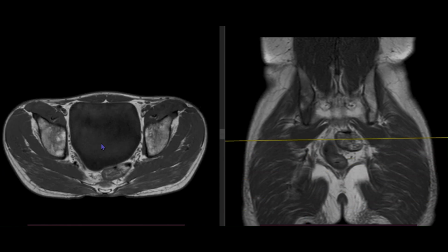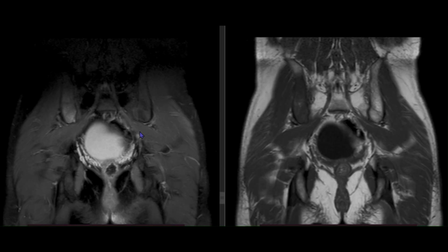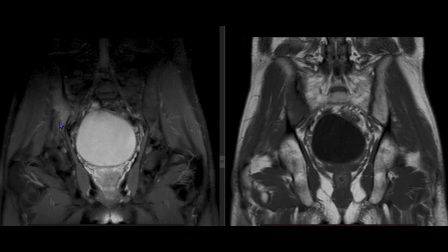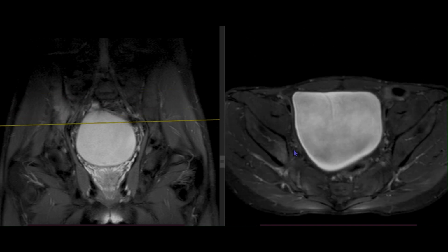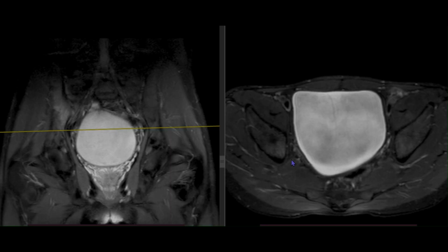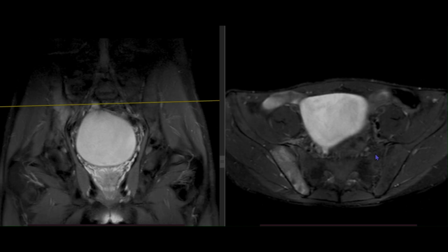However, this type of infection usually comes late. Based on the type of symptoms, usually the patient would ignore it and would come later on, but this is a good catch clinically as well, as the patient had come earlier. So one more thing that we need to see is the sciatic nerve, which is coursing just here up somewhere in the sciatic foramen as it exits outside. So we should know whether there is any involvement, any neural edema. We should compare it with the opposite side.